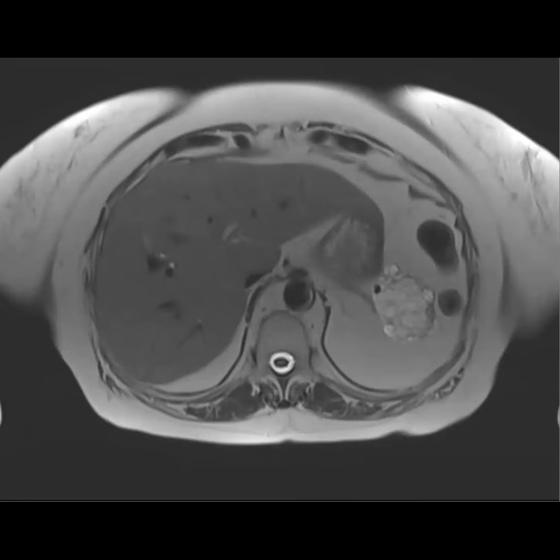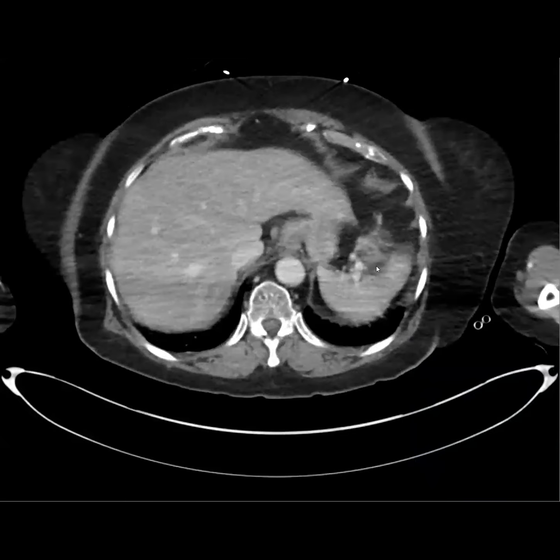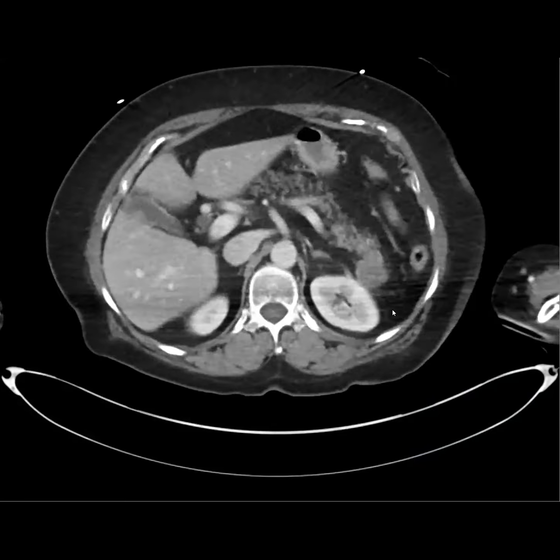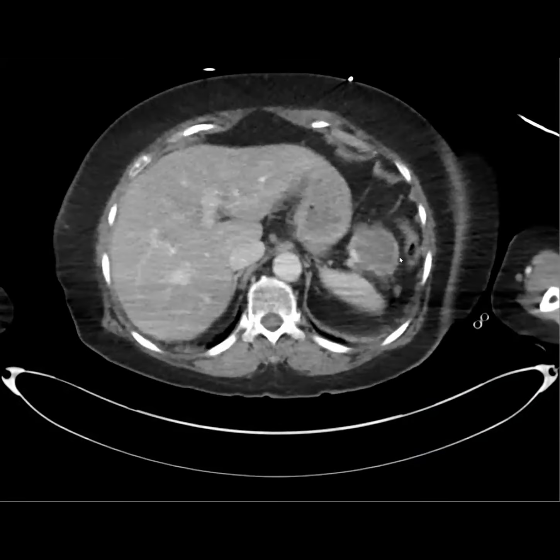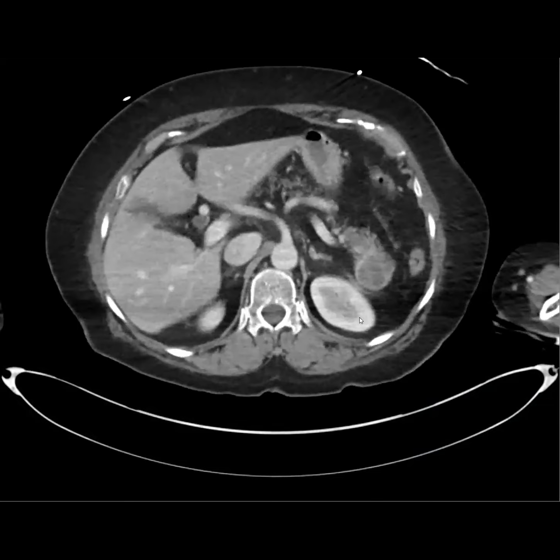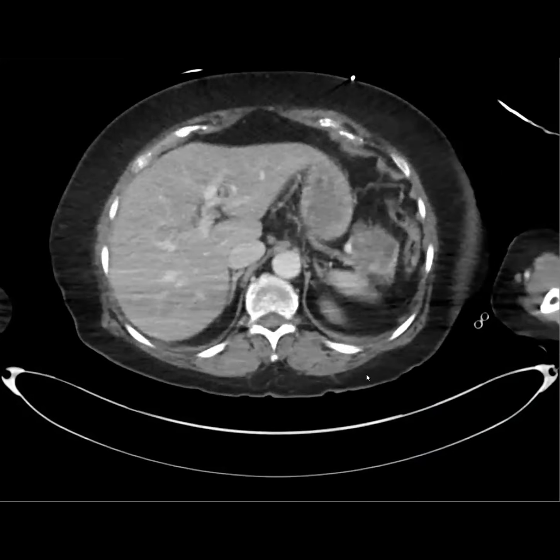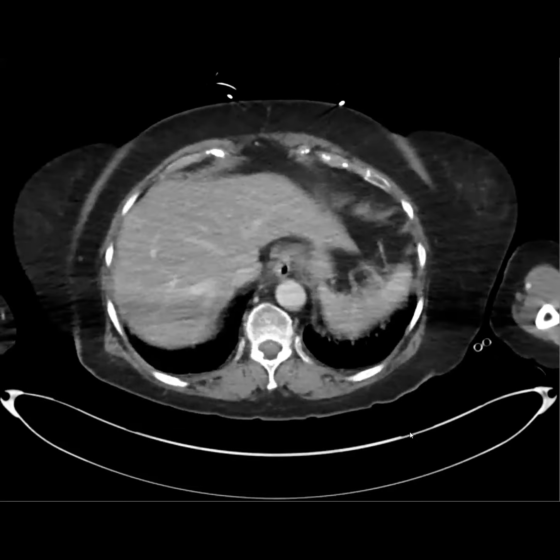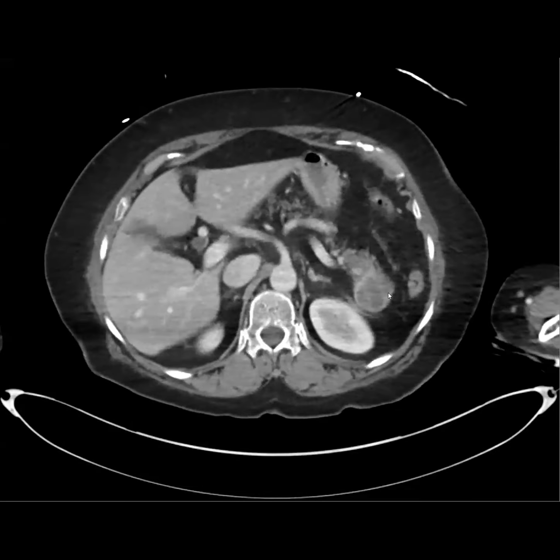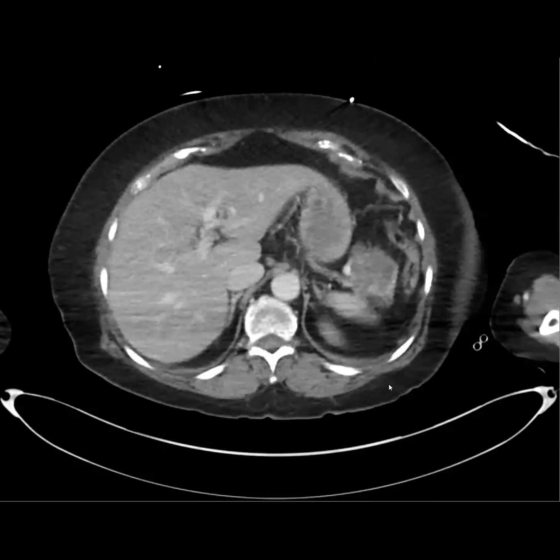We re-looked at the CT and we were all thinking this is a necrotic mass, but in retrospect, maybe it looks kind of lobulated, maybe it looks kind of cystic. We could have saved them an EUS by doing an MRI. I don't know. I think if we did that for all cases that look like that, you'd be doing a lot more MRI than is warranted. It's just a tricky one, right? It's a good reminder. And I think the sequence of events for this case is totally appropriate.